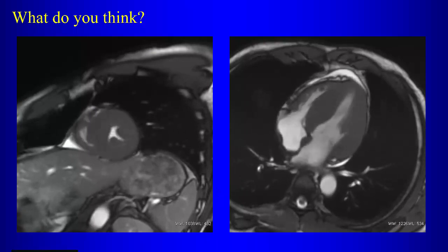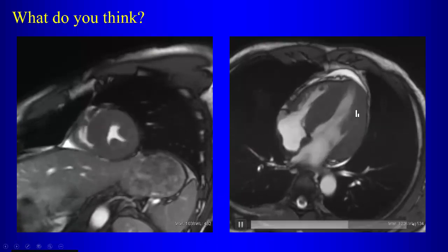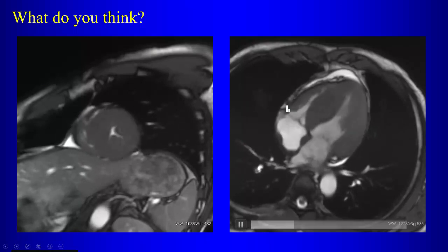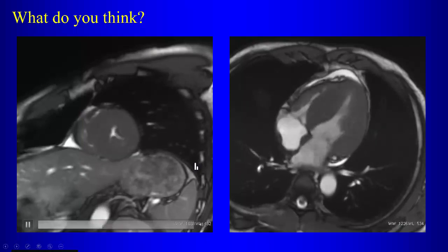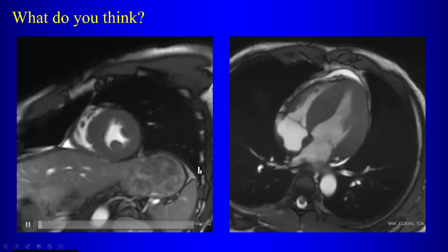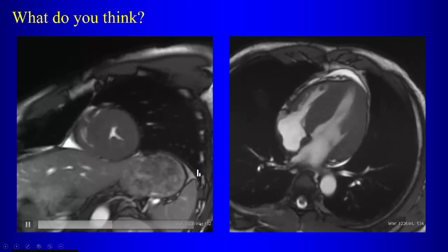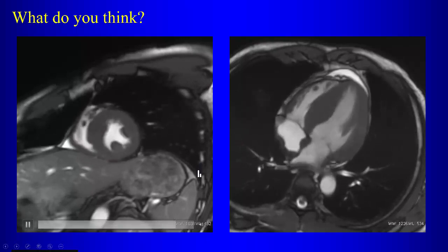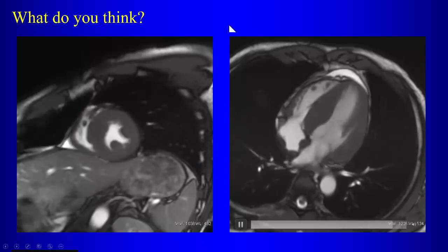Septal hypertrophy? Okay, is it just the septum? No, it's also lateral too. Yeah, especially the septum, but also some lateral wall. So there's myocardial hypertrophy, right? Now, so far we've covered two things that would be in the differential, right? So what are those two things that we've covered already? Right, so hypertrophic cardiomyopathy and Fabry's disease. Both of those can cause abnormal thickening of the myocardium, okay?